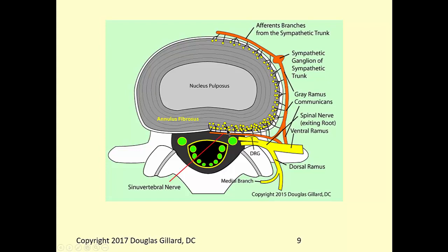And so at L5, in a disc level cut, in fact, the traversing roots are already out. I don't know if we talked about that. I better talk about that. Let's talk about the players here. So behind the disc, there are 4 sets of nerve roots. There are the exiting nerve roots, which I drew in a cartoon. Really, in an MRI, you would just see a piece of it, like you're seeing a piece of this. So there's the exiting nerve roots. If this is L5, this is the exiting L5 nerve root.